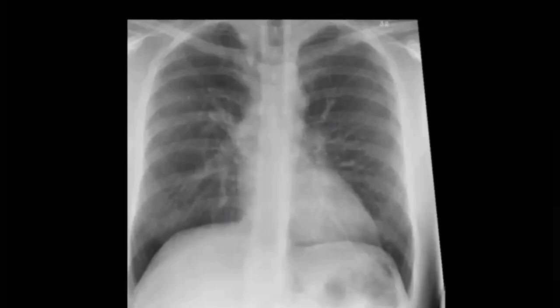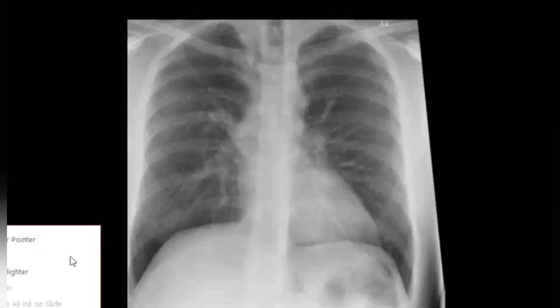I am provided with the frontal X-ray chest of a skeletally mature patient. I am able to appreciate a bulky right hilum, and there is linear engorgement of the vessels, predominantly on the right side. The concavity of the hilum on the left side is also changed into convexity.